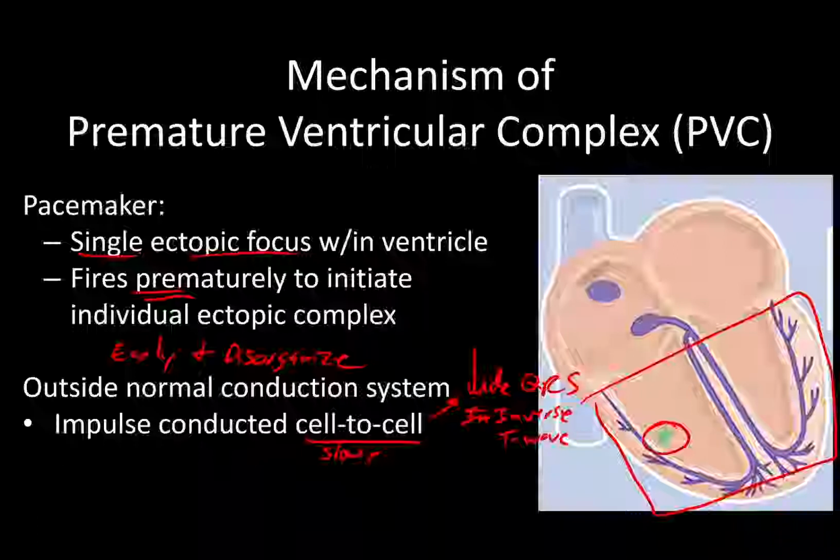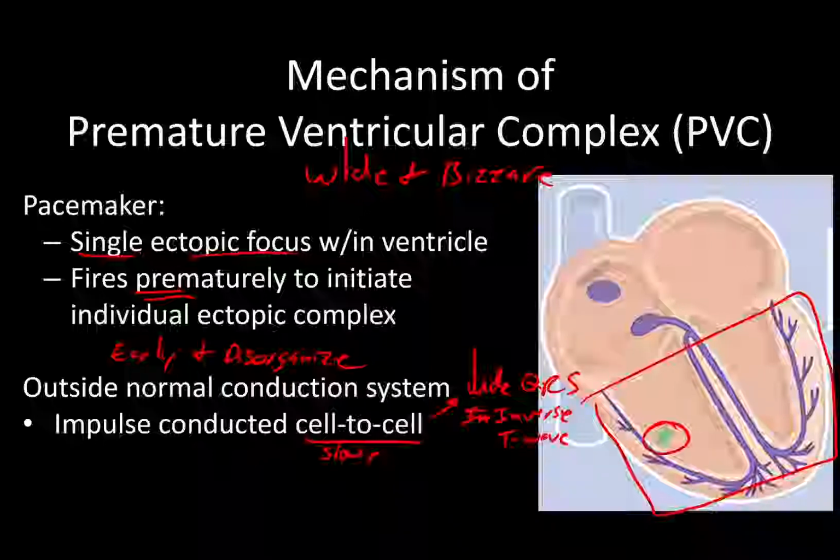More simply put, wide and bizarre. There we go. So let's walk through a few of these and help you get a better idea of what's going on.